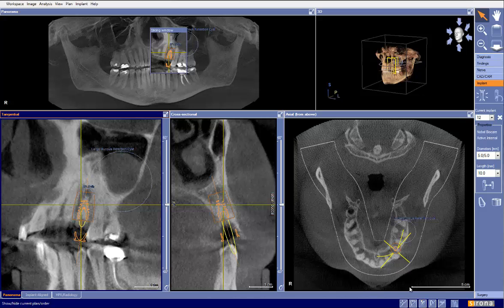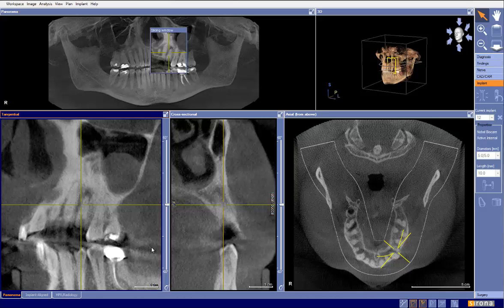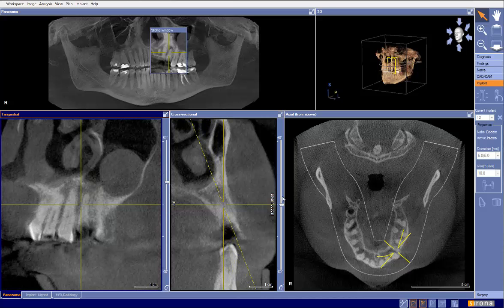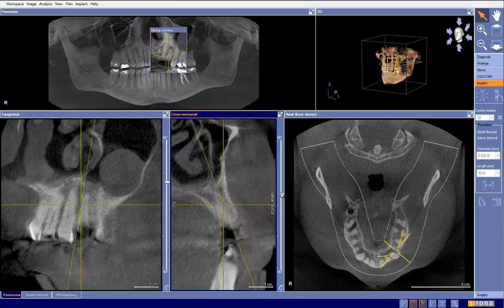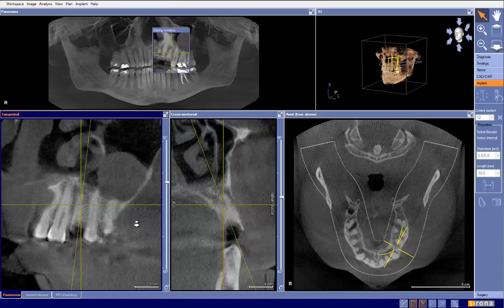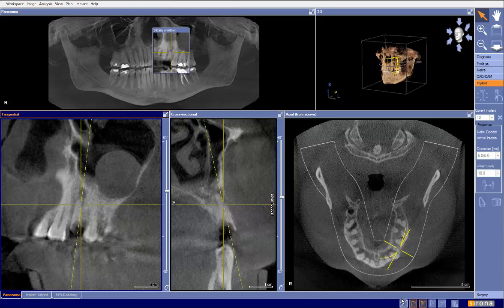the copy button. So by being able to come here, highlight this, go image, 2D screenshot, copy to clipboard, we're able now to paste this image, this particular section here, into our EagleSoft. And to make this a little bit better, what we could do is use the various tools within the software here to get the most accurate image to allow us to see what's going on. And now we can clearly see this lesion right here. So just wanted to point that out to us.